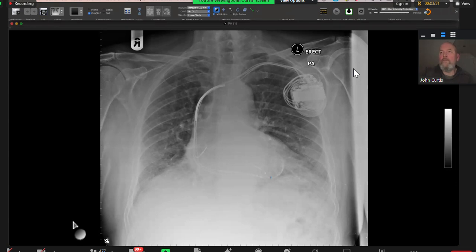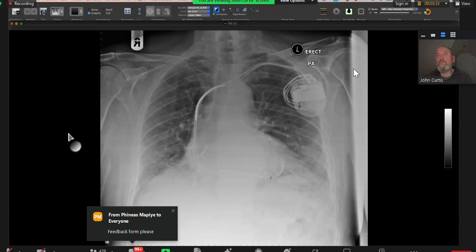This patient presents with a stroke. So I'm provided with the frontal chest radiograph of a skeletally mature patient, in which I can see that there is a pacemaker with two dual chamber leads. One is in the right atrium and the other seems to be in the right ventricle.